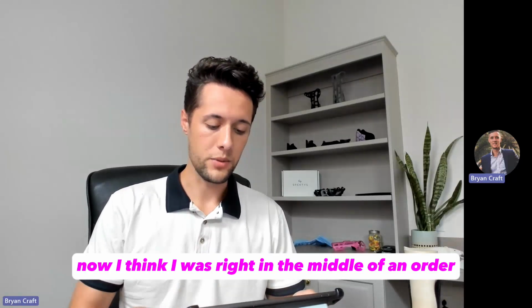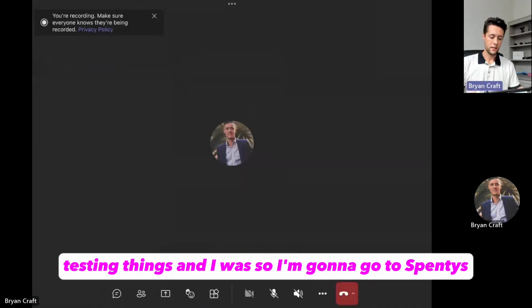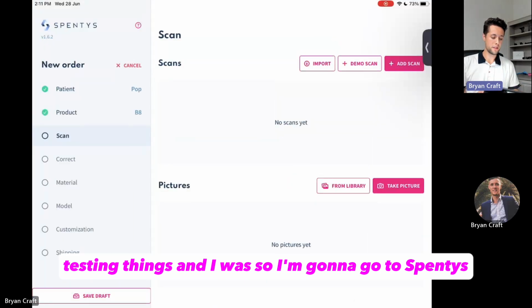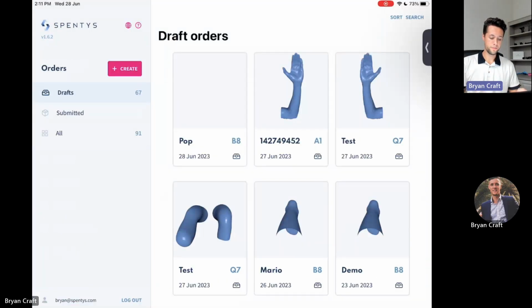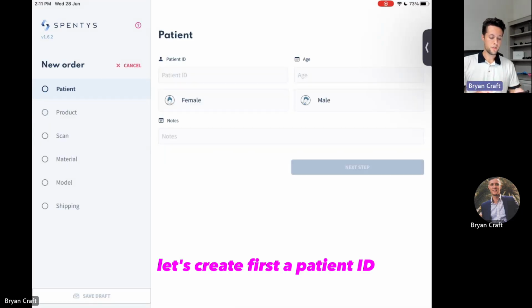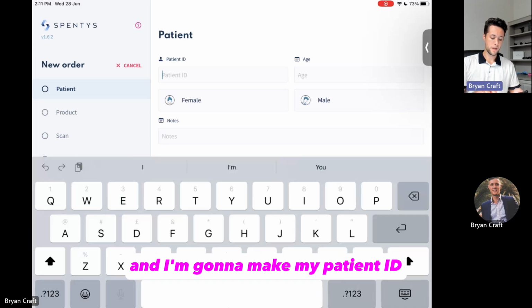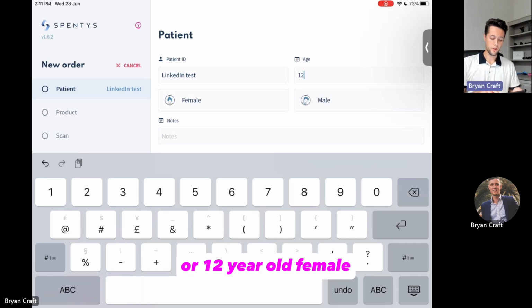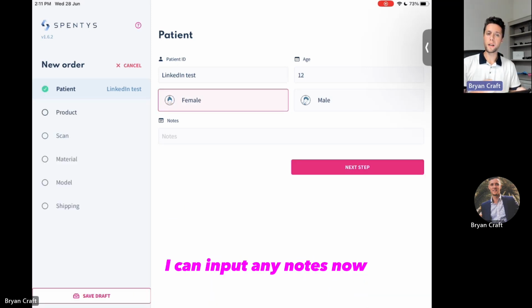Now, I think I was right in the middle of an order, testing things, and I was. So I'm going to go to Spentys and I'm going to start a new order. Let's create first a patient ID. And I'm going to make my patient ID LinkedIn test for a 12-year-old female. I can input any notes.